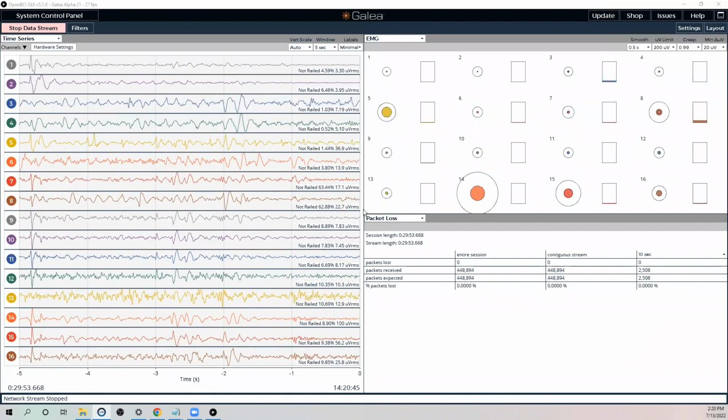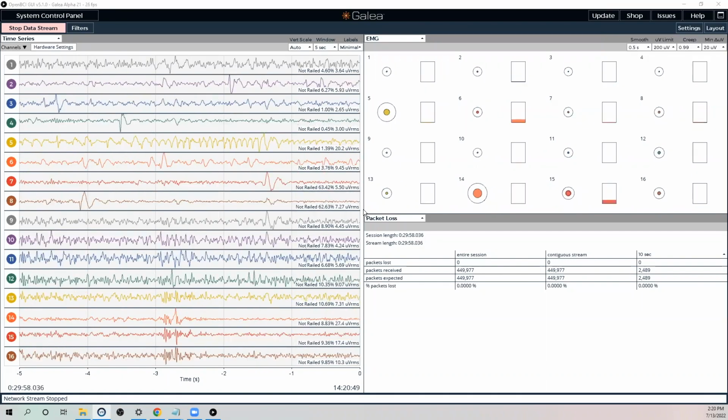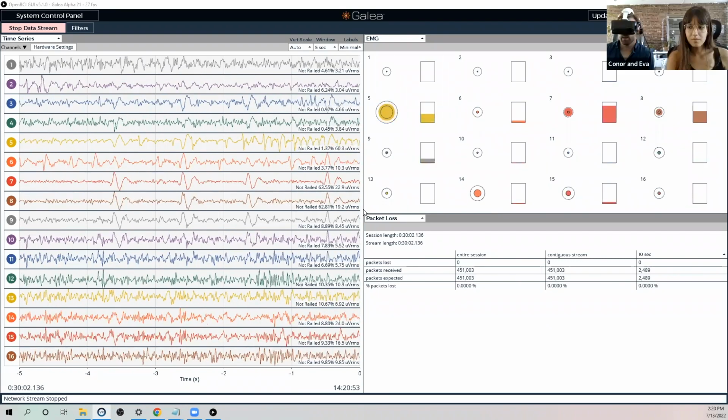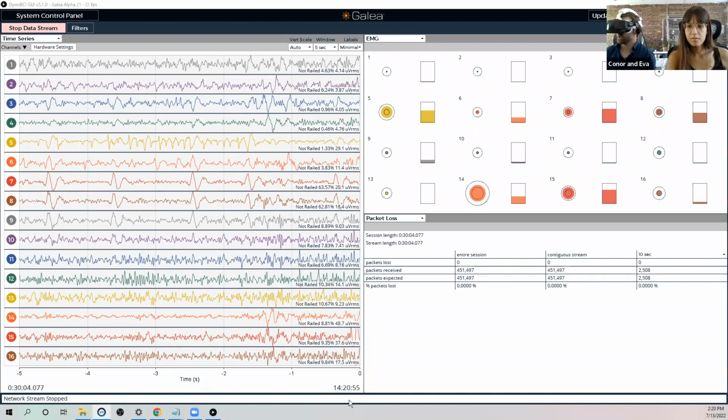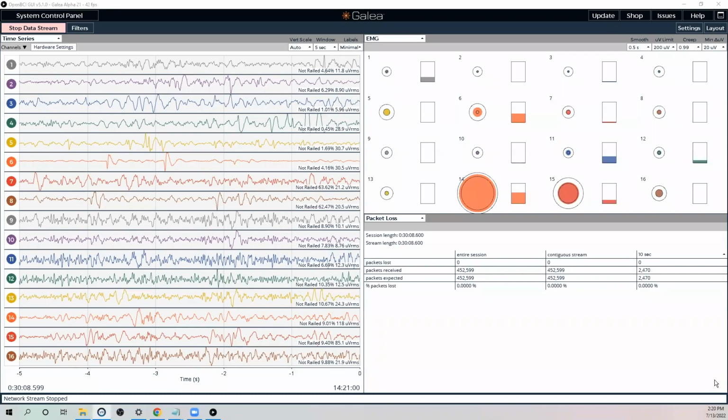Are the dry electrodes replaceable? Or talk about the electrodes, cleaning the electrodes when they wear out, and also replacing them. Yeah. Why don't we, should I take the headset off? Yeah, maybe stop sharing the screen and go back to showing the device itself.